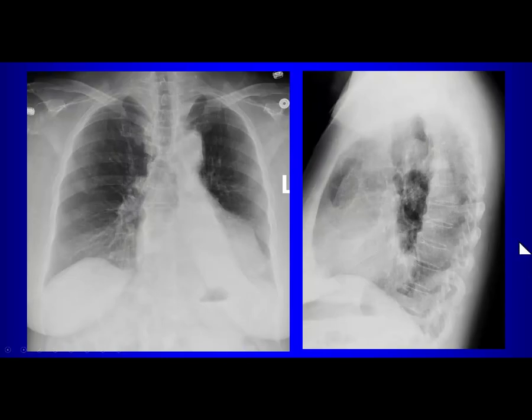Now here's a lateral view, which you don't usually get on your patients. Okay, what's the abnormality on the lateral view?